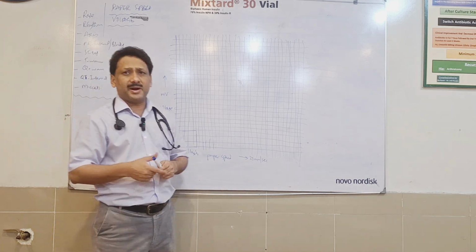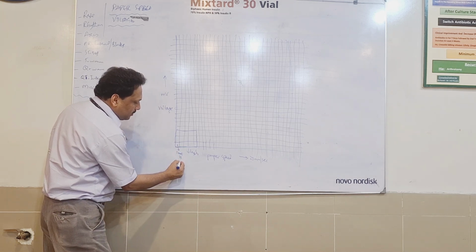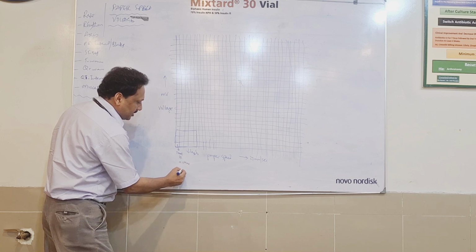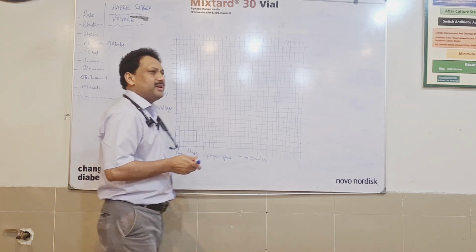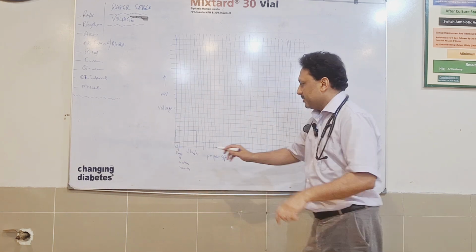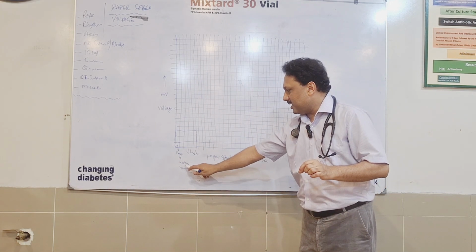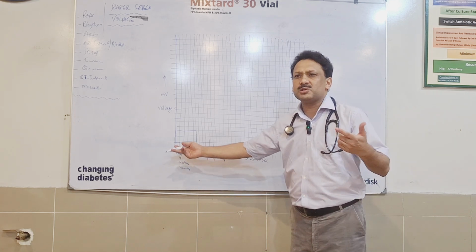What does it mean? One small square is equal to 0.04 seconds, or in other words 40 milliseconds. So if somebody ever asks you what the small square represents, you would always say this is equal to 40 milliseconds, or we also call it 1 mm.